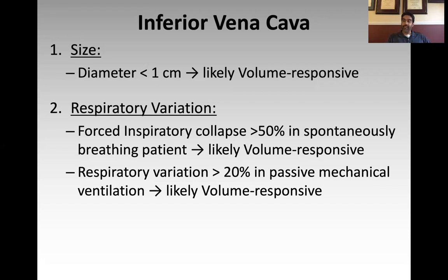So a small IVC is helpful. A big IVC doesn't necessarily mean anything. Okay. An IVC diameter greater than 2.5 or whatever your arbitrary cutoff is does not necessarily mean that the patient is not going to respond to volume. Okay. But if the IVC is small, that's helpful.